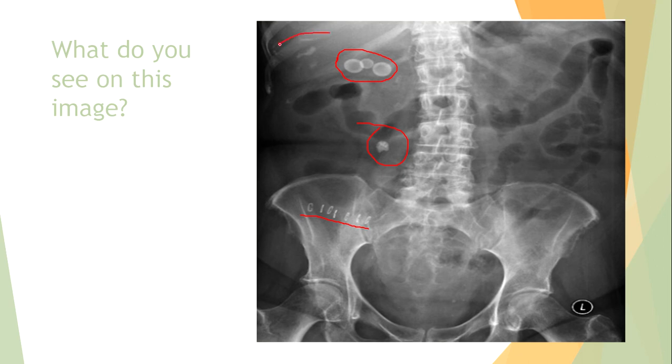This is part of the lung. Here we see maybe one of the possible reasons. It can be fibrosis after consolidation of the lung.